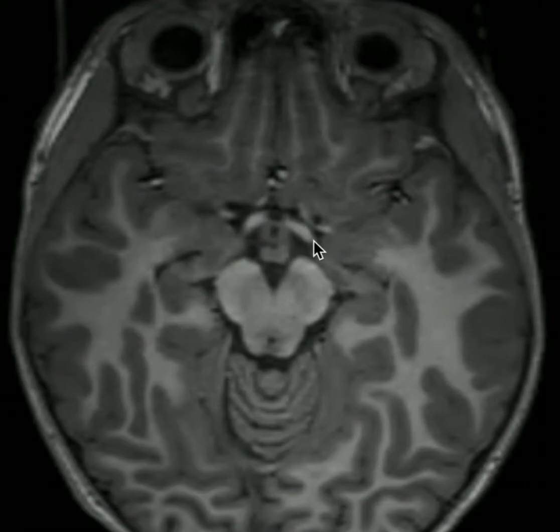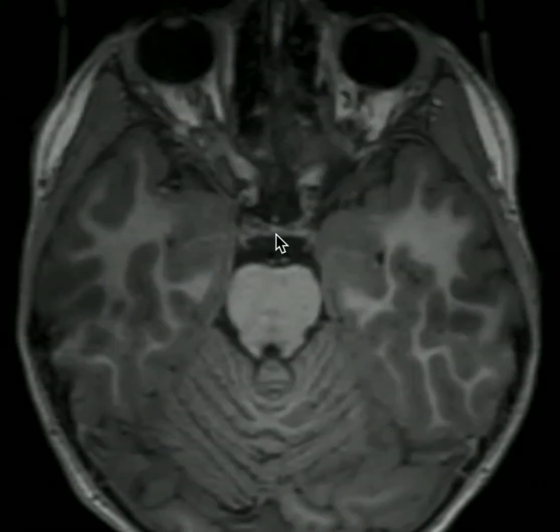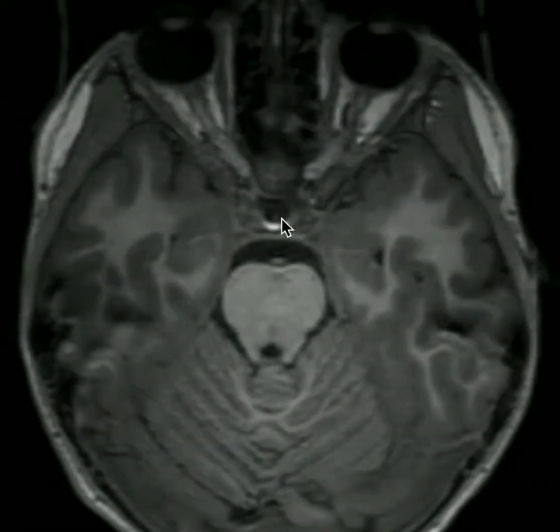here on the left. This is the floor of the third ventricle, and on this slice we're seeing our supraoptic or chiasmatic recess here anteriorly and the infundibular recess behind it. We can follow this inferiorly along our pituitary stalk or infundibulum until we're at the sella region where we'll see our pituitary gland, right here. Posteriorly, we have the bright signal corresponding to the neurohypophysis, right here.